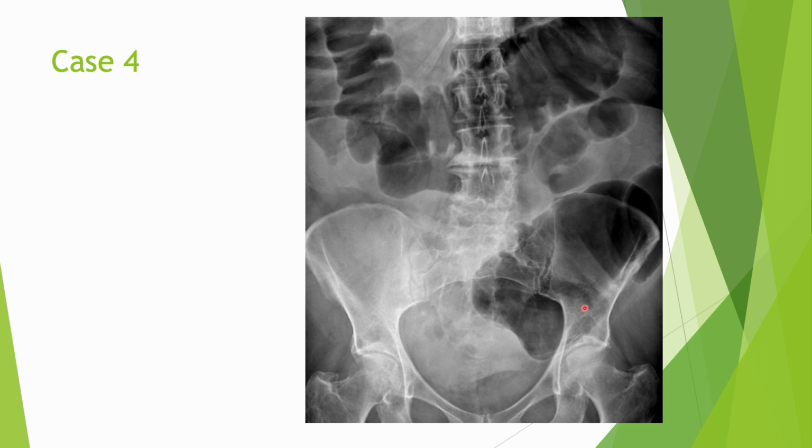So this image is demonstrating large bowel obstruction. So you can see more peripheral located bowel with haustra, so it's not going all the way across. It's much larger than the previous images.